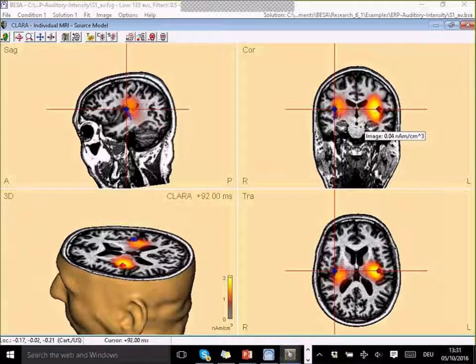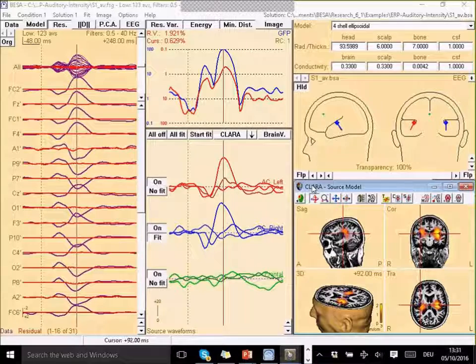And in the surface, we have the surface-based two-dimensional Laplacian operator, and that again causes a slightly more focal result for the LORETA. I don't think I can say that one method always works better than the other. For some applications one method may work better, and for others another may work better. So it's always good to try at least one volume and one surface method, I think, and see if they give us similar results.